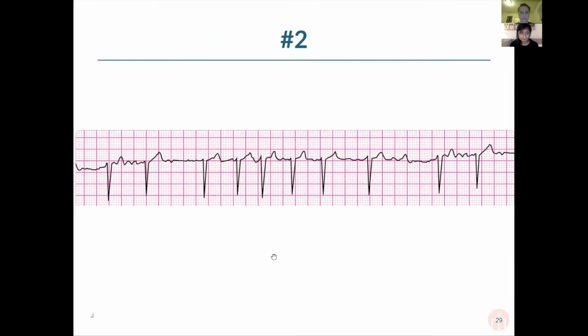Awesome. All right, guys, a little bit trickier here. What do you think's going on here? Take a good look at some of your intervals. Got some great ones already. People are already describing what you see, which is always great too. I see some people saying irregular rhythm. That is absolutely right. Irregularly irregular, to be more specific. Perfect. I see a lot of people shouting some of those out.